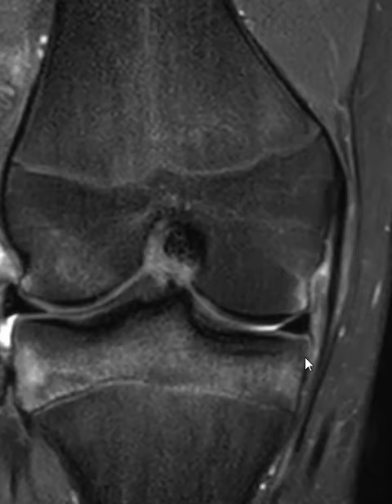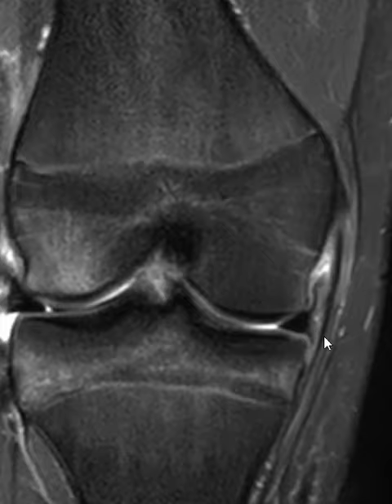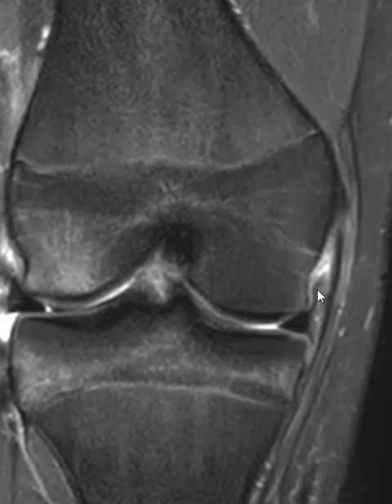But if we look here, we can see the inner capsular fibers, part of the joint capsule comes up here, and it blends with the peripheral rim of the meniscus. As we go up here on this view, we can see it continuing on up, and it ends right here. So this is the inner capsular fibers, or the inner component of the medial collateral ligament, and it looks like it's intact down in the tibial side, and it's intact as it attaches to the meniscus body. But up here at the femoral attachment, it is torn and pulled down.